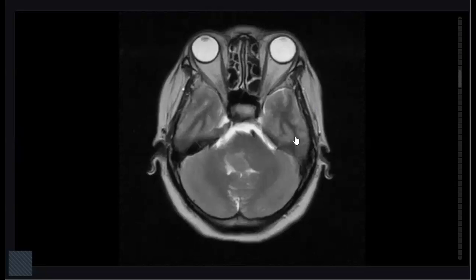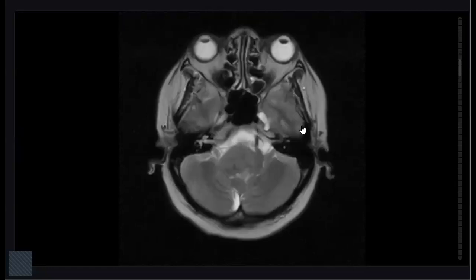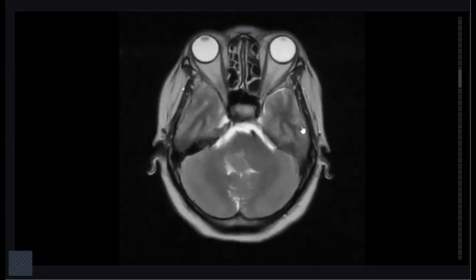What's your differential here? This finding may be due to infective etiology with the hydrocephalus, most likely due to meningeal enhancement. And second, there is an area of altered signal noted in the posterior cerebellar vermis. This could be an infective cause, could be tuberculoma, could be a slow growing tumor which is causing obstructive hydrocephalus. So this needs a post contrast scan before giving any reasonable differentials.